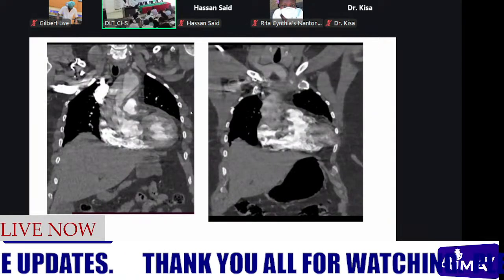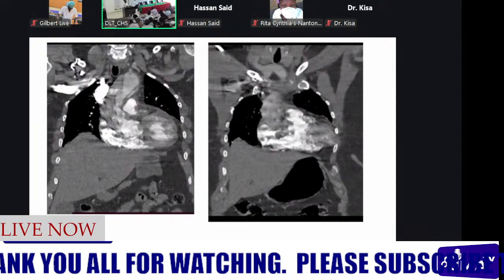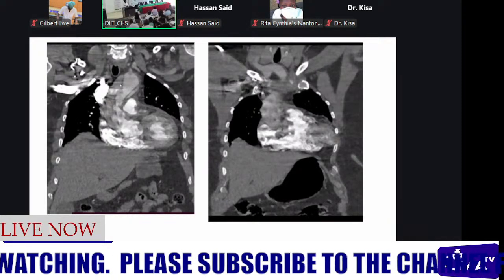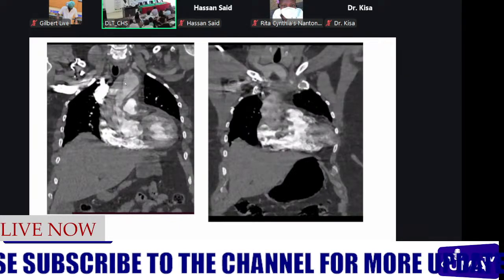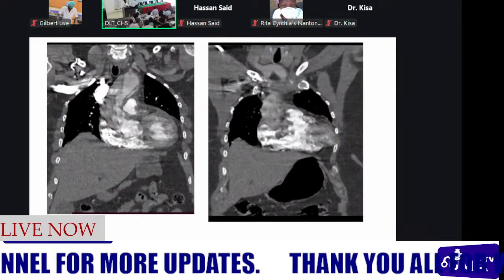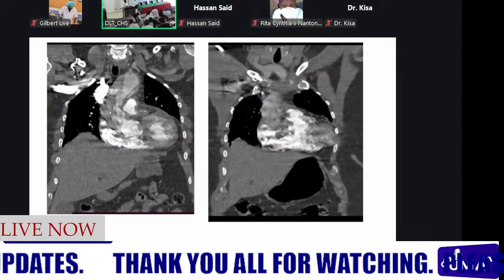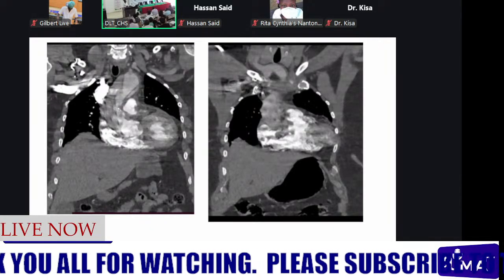Then in these two images, we have a coronal view. I wanted us to appreciate that we are still able to see our true lumen here, which is surrounded on either side by the false lumen. And we see this hypodense linear structure, which is separating the two lumens. When you follow down to the level of the aortic root, we see that there's actually extension of the dissection down to the aortic root.